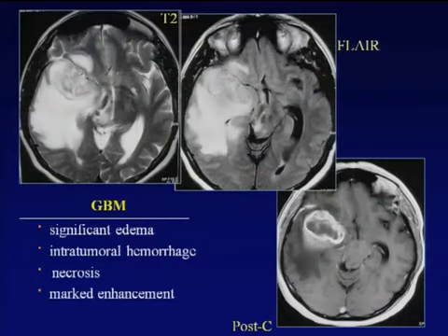The tumor on T2 and FLAIR images, you see the abnormal enhancement, and all this edema. And if we have to be correct, it's not edema when we are dealing with a primary tumor. All this area around is a combination of vasogenic edema along with infiltration of tumor cells. We know from histology that in primary intraparenchymal brain tumors, we have fingers of tumor along the perivascular spaces, not only outside the rim of enhancement, but some people believe well beyond the area of abnormal T2 hyperintensity. We may see tumor here. That's why the advanced neuroimaging techniques are very useful.